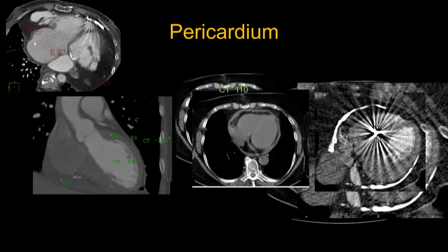And that's why, for instance, CT is very useful to look at calcification, like in this patient. With this, there's no other thing it could be other than calcium, what you're seeing here, okay? Same here, for instance. This is a patient that has a lipoma of the RV. You can measure the Hounsfield unit is around minus 100. There's no other thing. It's fat for sure. There's no other thing that could have a similar Hounsfield unit.